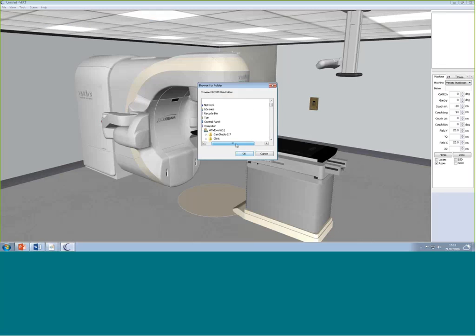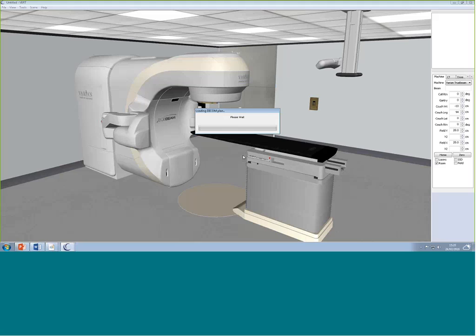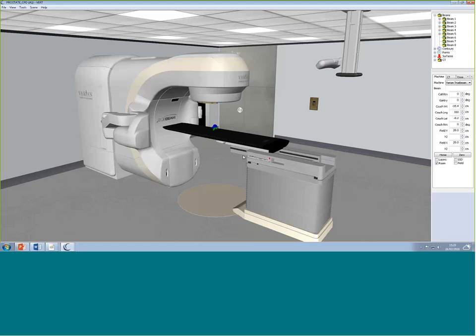For the purpose of this, I put the prostate session on the desktop. You can see here the prostate and the cervix session. They come with 4 subfolders, and they're both in the same format, so once you've watched one, you'll be able to set up the other session in the same way. The first folder is the DICOM patient, and you can just load that in. This is why it's good to remember to put this in a location on your desktop that you can remember.